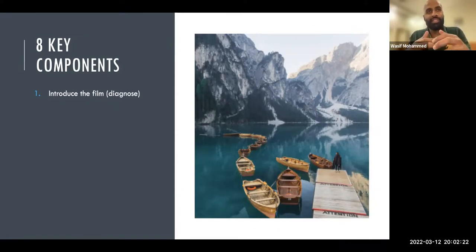And the examiners these days are showing live cases. They're showing them through the Osiris platform, right? So it's not possible for them to filter out the data completely. These things can give you an important clue towards the diagnosis. So just 1 second, look at the periphery, come back to the center, and start describing the exam. Take your time, 3 to 4 seconds, and just describe what exam it is. So this is a frontal chest, for example, right? You want to say something like, this is a frontal chest X-ray of an adult patient.